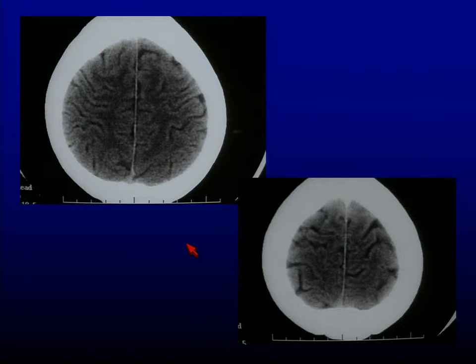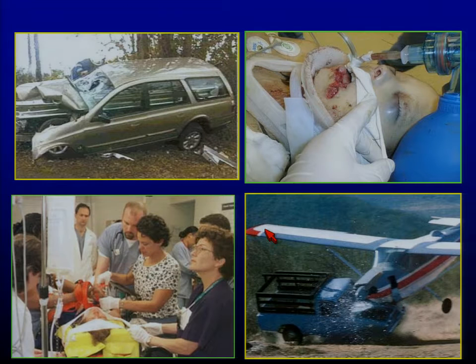So once you get out of the high rent district, you're back in the low rent district of the brain. As I was testing people, when I first was figuring out how do we teach how you read a head CT, it was very unusual that people missed diagnoses once you got out of the basal ganglia region of the brain. Epidurals, subdurals, which we'll look at, are much easier to identify and are not as subtle as things like increased intracranial pressure, subarachnoid hemorrhage. So, it's important to look at all the cuts you have, but it is unusual you will miss pathology up here on the higher cuts, but it is not hard to miss pathology on those lower cuts.